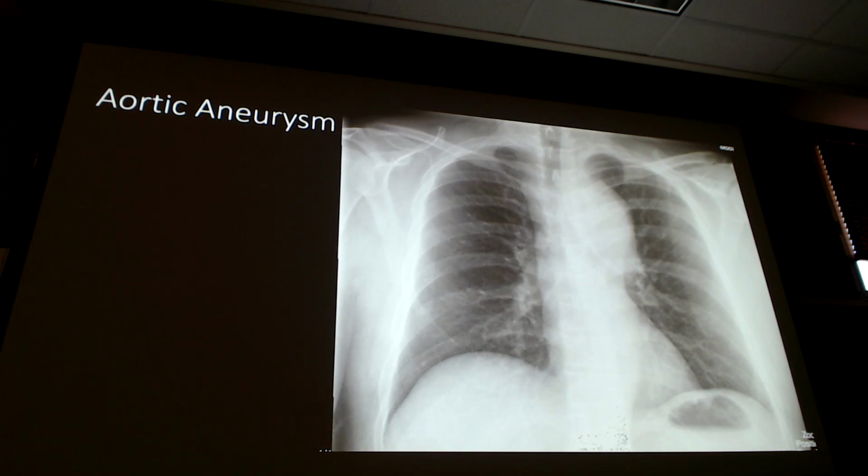What do I notice here on this X-ray compared to the hypertensive cardiovascular disease ones? What is not present? Cardiomegaly, left ventricular hypertrophy. Look at that left ventricle, right? So now this leads me to believe that this is from a different cause potentially. This is definitely not from long-standing hypertensive cardiovascular disease, because I don't have an enlarged left ventricle yet. Right? That's going to be probably step one before I even get to the aorta, because trying to work harder is going to get bigger. Good.